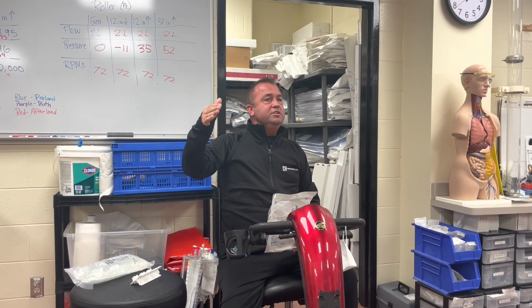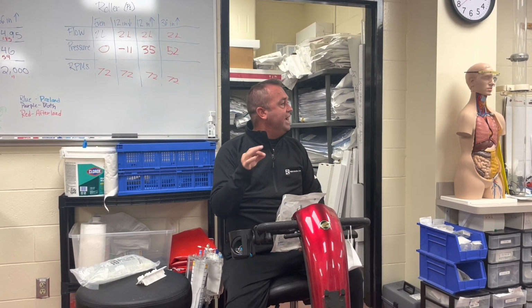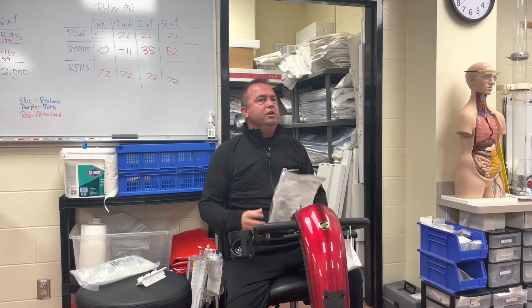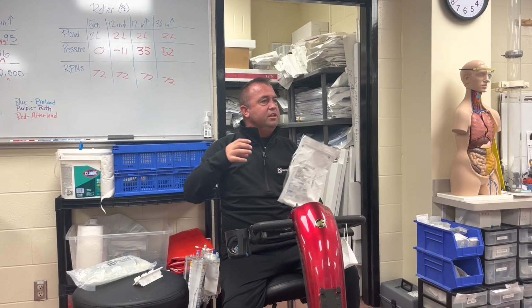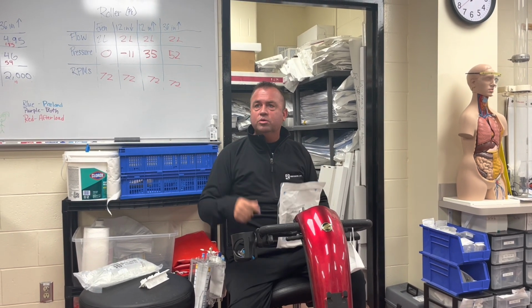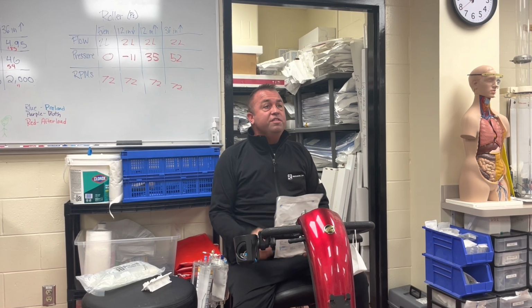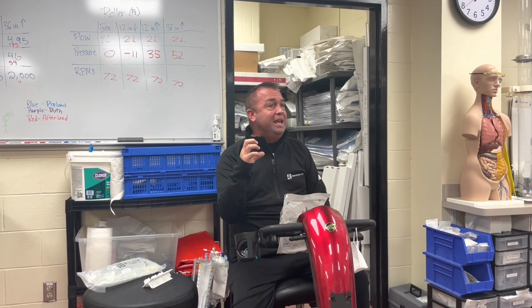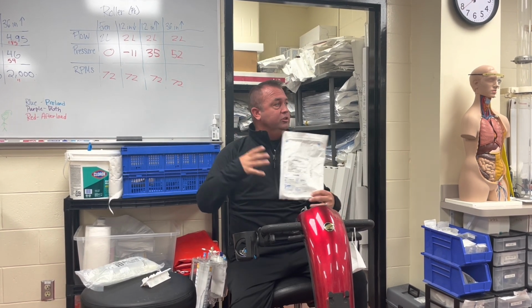So again, there's a pressure tubing that comes down off of some catheter or off of a piece of our tubing. What do we want? Do we want very large tubing with thin walls, or thick tubing walls, or small tubing? What do you think? Probably thick wall tubing, so it takes the elasticity out, right? Because otherwise it will dampen the pressure. Long tubing, short tubing, big tubing, little tubing, what do you think?